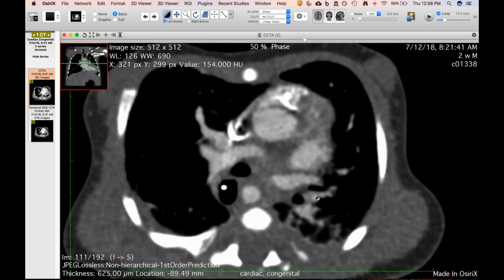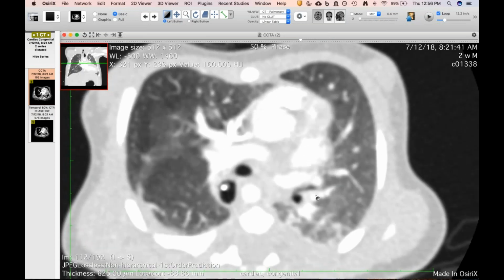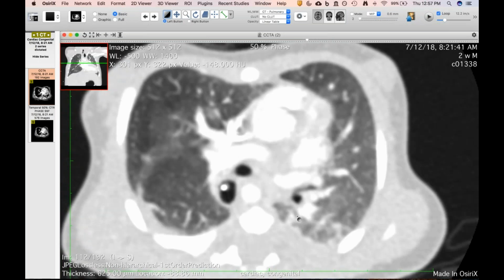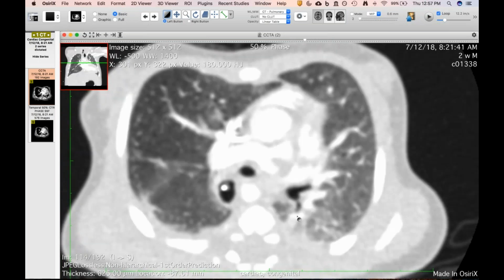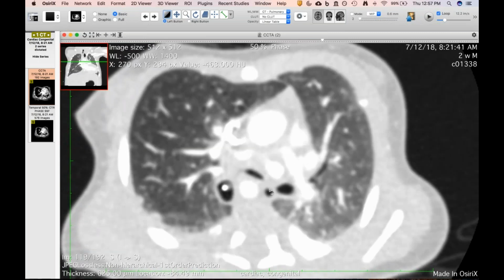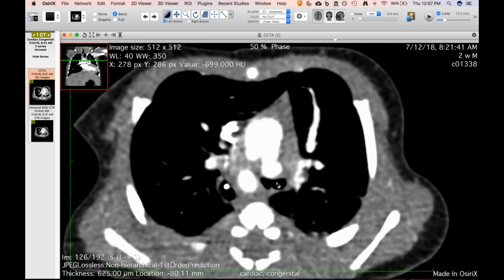Does it ever get into? No, it never really goes anywhere. And you can see the superior segmental bronchus in the left lower lobe right here. So I think it's just blind ending, but it's just weird because it's so medial. And the right main stem bronchus is so long just based on where the trachea is.